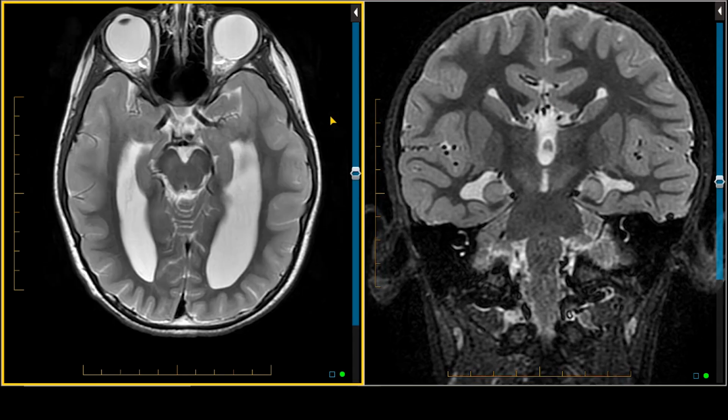One other thing we see in this child is there's an increased axial length of both globes. If we look from the anterior aspect of the cornea to the level of the optic nerve insertion, there's some posterior protrusion and an increased axial length. This needs to be further characterized with an ophthalmologic examination and may be indicative of some underlying genetic underpinnings to this disease process.